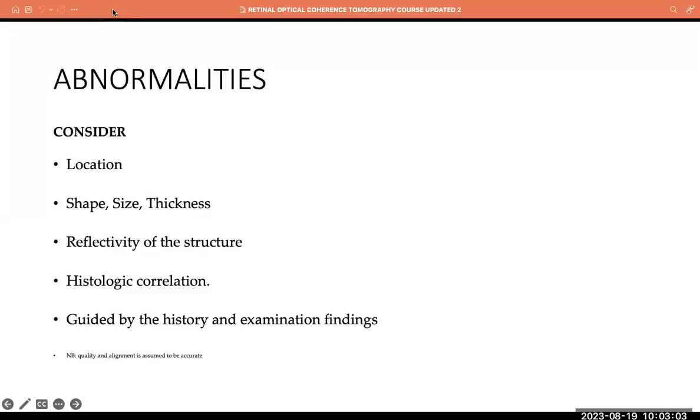One of the questions was, don't forget to explain how you could use the scan to know which eye it is. You brought up a scan where there were 3 images. One of them showed the optic nerve head, and the optic nerve head was on the right side, so that shows that it's the right eye. Underneath, the retinal map itself showed the thickened retinal nerve fiber layer on the right side, so that shows it's the right eye. I remember you mentioned those two.